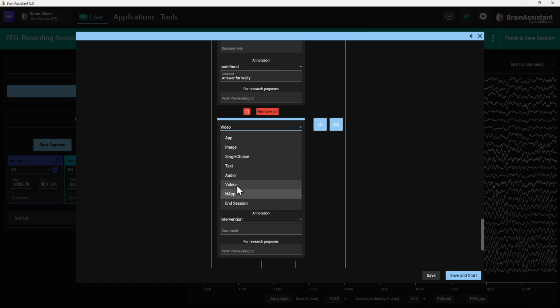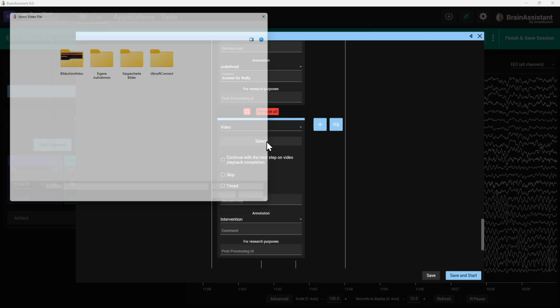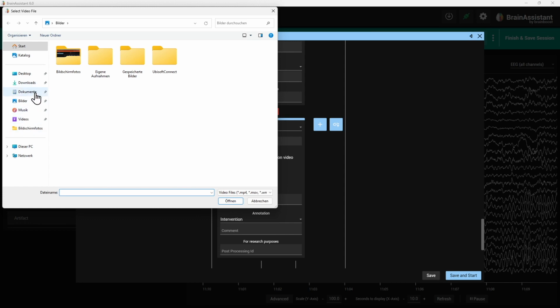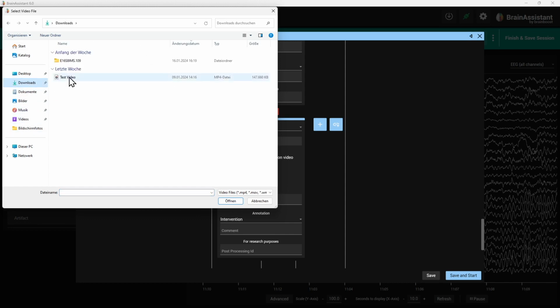We can now use a video. So you can say, okay, I'm selecting a video. Okay, where is one? Downloads probably. Here, test video.